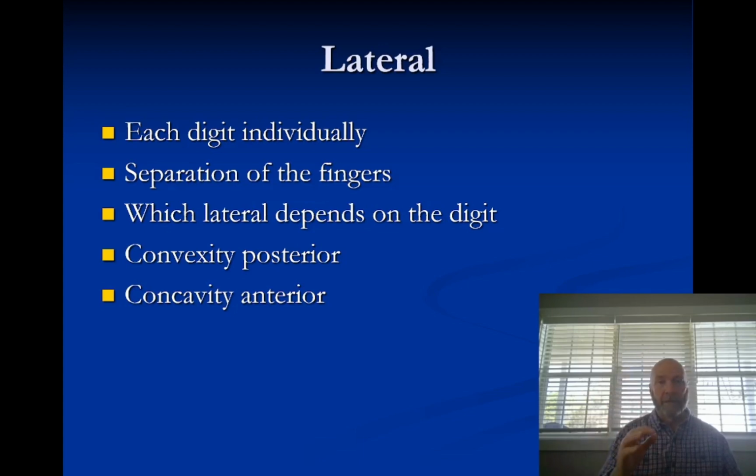She didn't finish the program. She was a good student, but she just decided it wasn't for her. But anyway, we were going through individual fingers, and I wanted to see what she would do with the ring finger. So that's fourth digit, 1, 2, 3, 4. Remember this, even though we shoot PA projection, this is still lateral side because the anatomical position is the lateral side. So it's 1, 2, 3, 4.